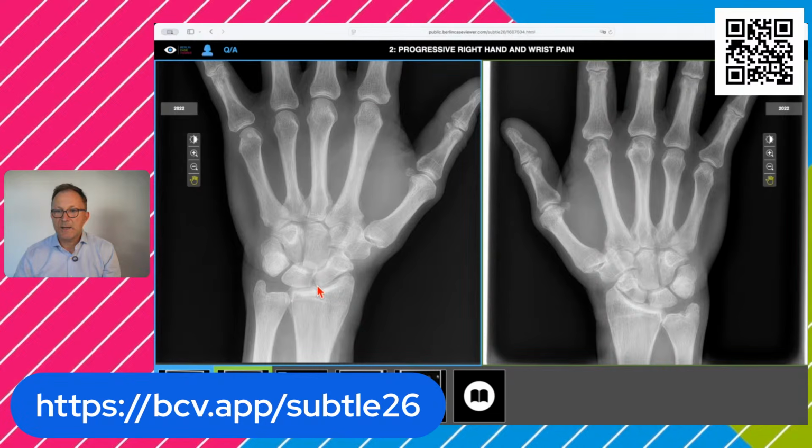So is there anything seen? Please write a comment. Someone needs to write a comment.